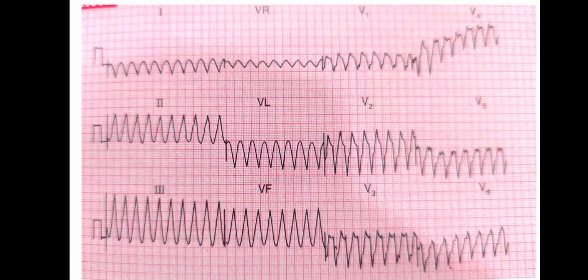In this third ECG, this is a very simple ECG, and even if you are just finding this rhythm on the monitors that are attached to the patient, you can easily comment that you are able to find broad complex tachycardia. Further, you cannot comment on the P waves or the ST segment. The one important thing is that broad complex tachycardia is ventricular tachycardia unless proven otherwise.